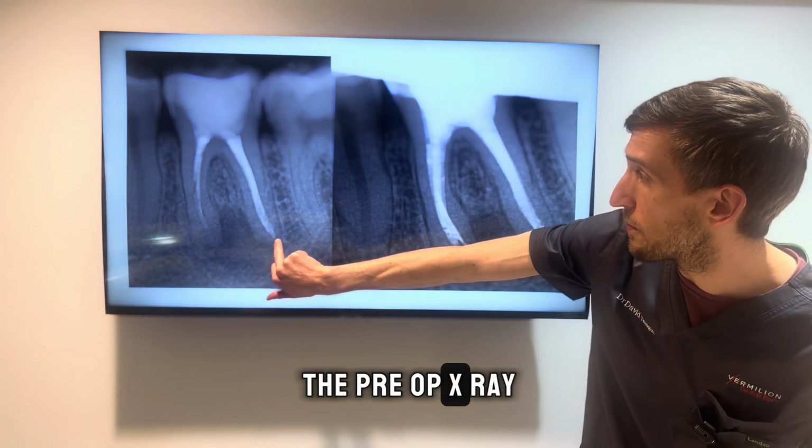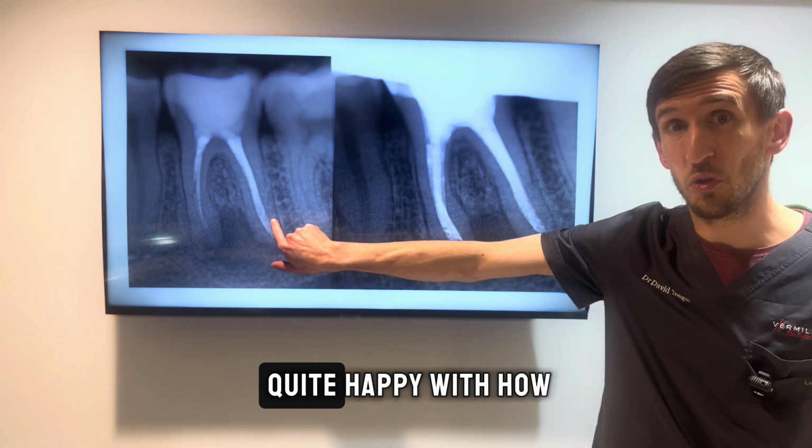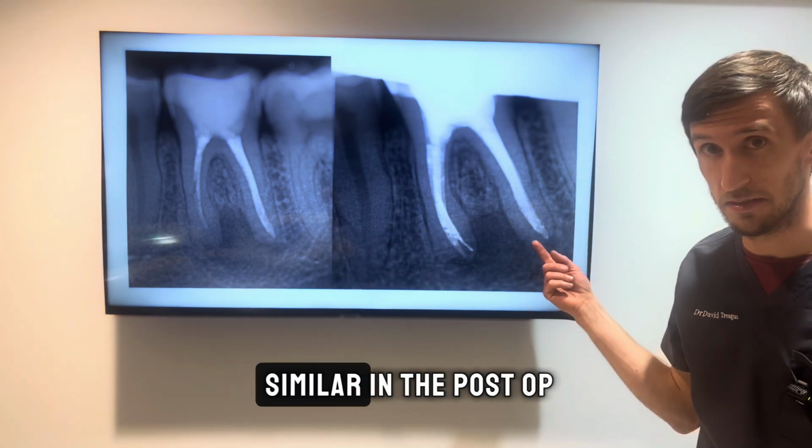On the distal in the pre-op x-ray, it looked pretty good beforehand, and so I was quite happy with how it looked, and it looks very similar in the post-op.